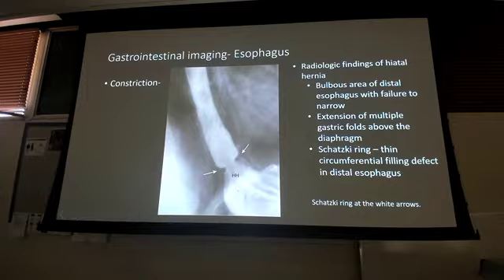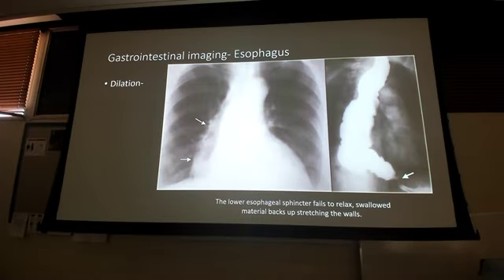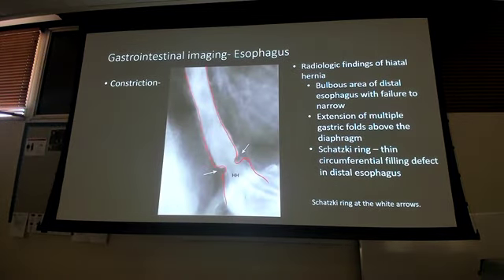So why is it constricted? Because I have my tubular structure and it comes in like this. And it's just a definition of constricted. Yes, there's also a hiatal hernia there. But if we're talking just esophagus, this is what constriction is. Not this. This is dilation. Notice the size of the esophagus is different. Yes, some would say, well, it's because the sphincter is constricted there, it's not getting through. Well, no, but that's a problem with the sphincter. The esophagus doesn't have that constriction in there. The esophagus is just dilated. Here, the esophagus is constricted.